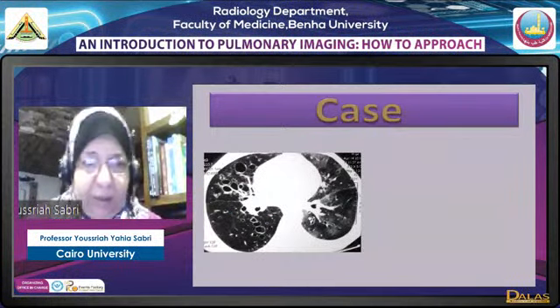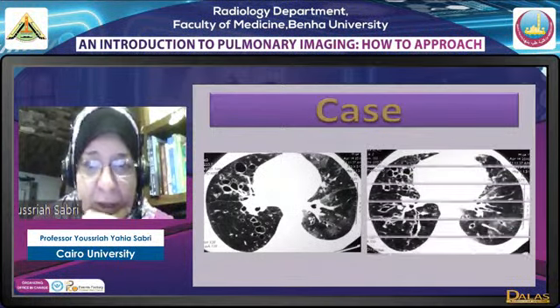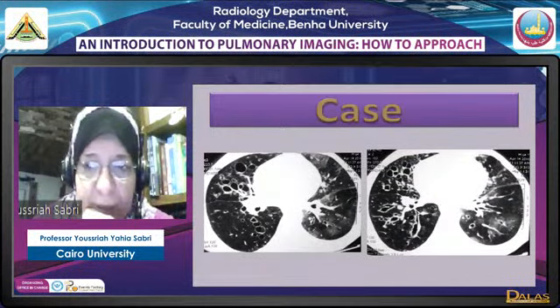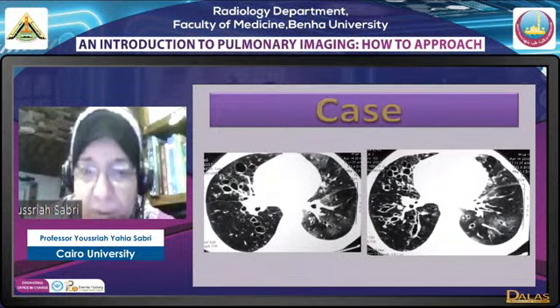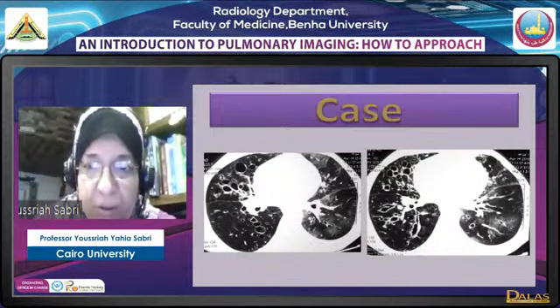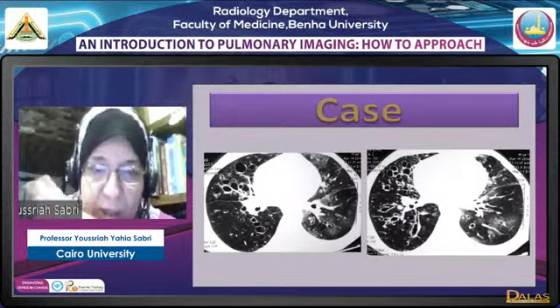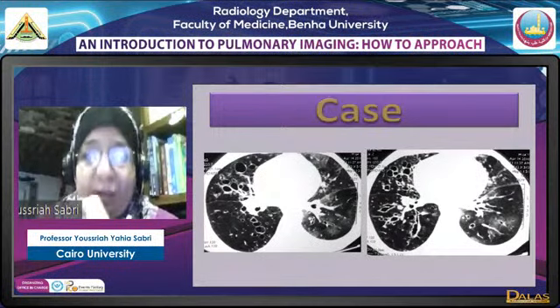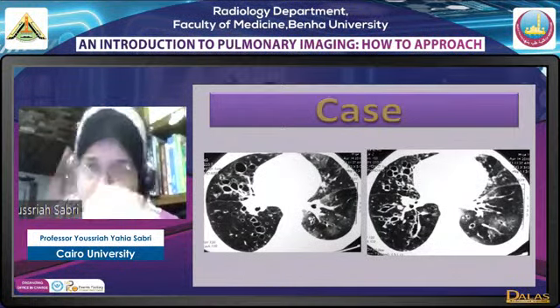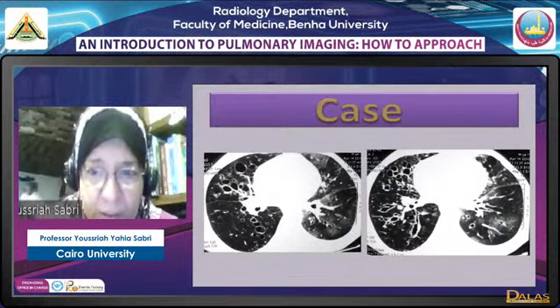Later on, as you can see here, this is large airway disease with bronchiectasis, cystic and fusiform. And if you look at the lung surrounding it and on the other side, you will find what looks like a mosaic pattern with the normal lung being white and the abnormal lung avascular and black. And this is classic for bronchiolitis obliterans, which is a small airway disease and a usual association of bronchiectasis.